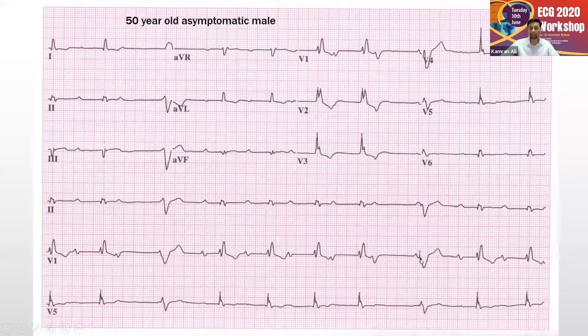It's a pacing artifact. So this patient, although a 50-year-old asymptomatic male, has a pacing artifact, which means he has a pacemaker placed. And most likely the AV nodal dysfunction was one of the reasons for this patient's pacemaker installation. This beat, which is very similar in morphology over here, is showing right before the third one. And you can see that these two are actually the paced beats. And in between, the native complex of the patient is a right bundle branch morphology.